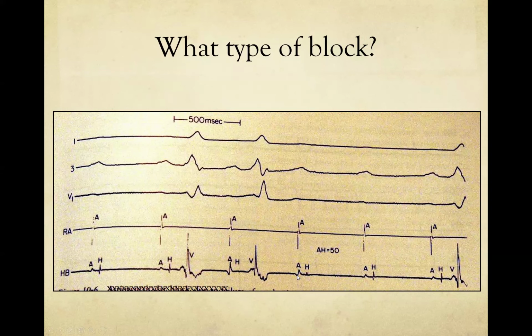And this is an unusual tracing. If you're doing an ablation and you see this, you are not happy, because it means you just did something very bad by injuring the His-Purkinje conduction.